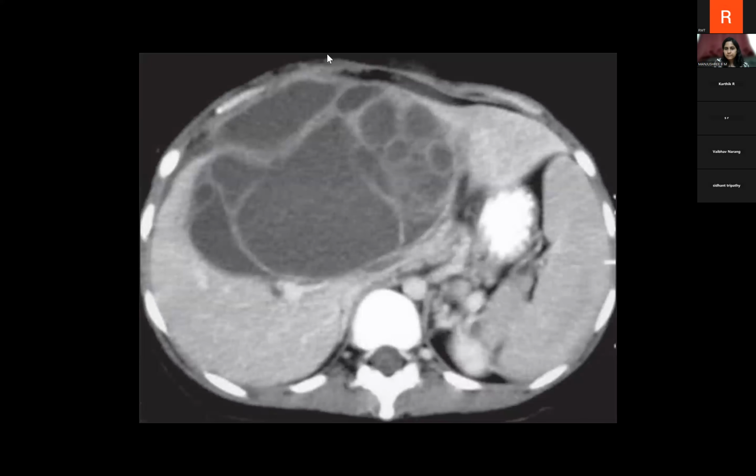Time is up. Okay. Nashreen has answered it correctly. It's biliary cystadenoma. Many of you have typed hydatid also. Let's discuss it later. Why is this not hydatid? This can be hydatid also, but why in this case you have to type biliary cystadenoma rather than hydatid.